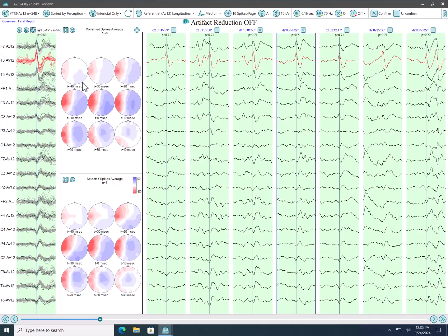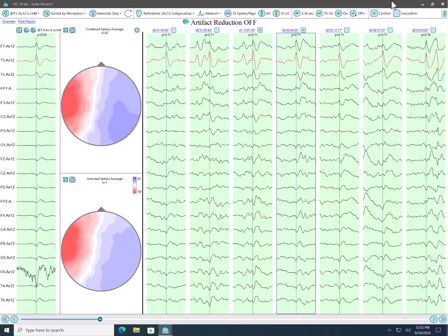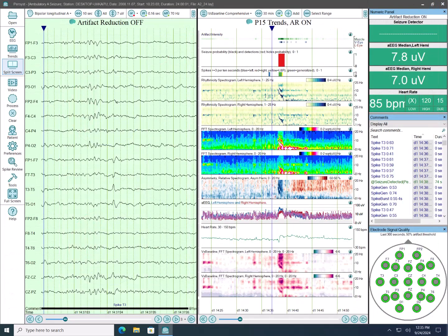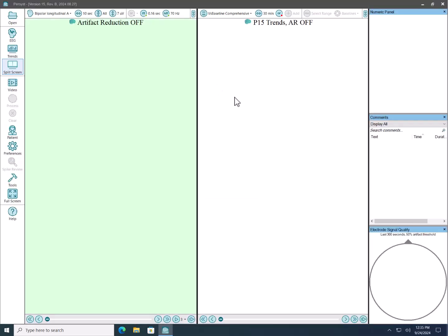I'm going to put these back to the original positions, and we're going to close this. I'm going to even close the recording, and we'll get started through those steps. Very easy to do, because those are the ones at the top of the user interface. And again, even the more advanced tools are fairly easy to use as well. We're always happy to meet to go over those.